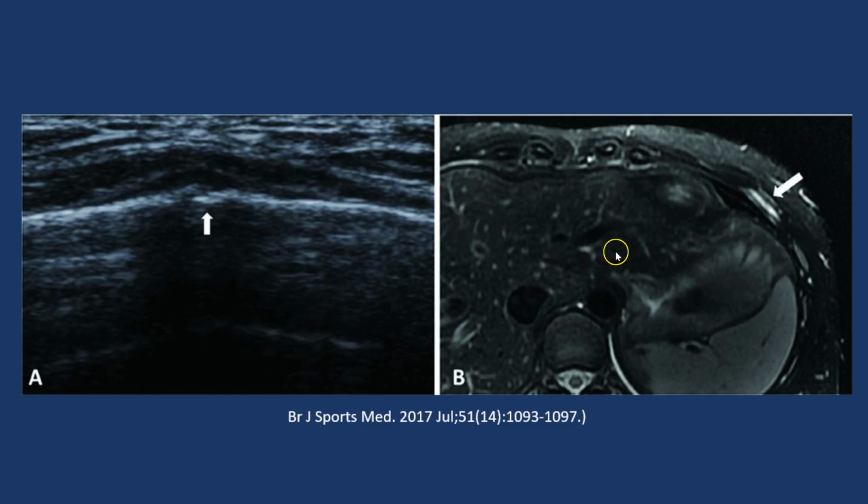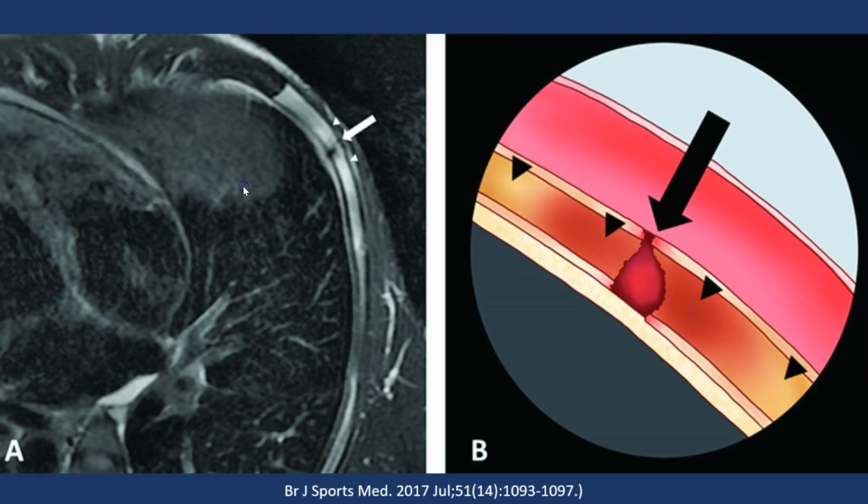In particular, if we have any concern that this is not a stress fracture and it's malignant or infectious in origin, then MR would be warranted to evaluate the bone marrow. But if you have high clinical concern it's a stress fracture, this is diagnostic. Cortical offset, displacement of the overlying soft tissues.